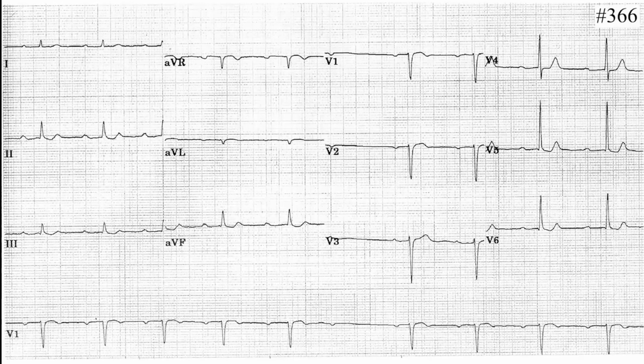Okay, so it's good. All right. The QRS axis is normal. It's more towards 60. And what else? The P waves are followed by QRS waves. Okay. What else?